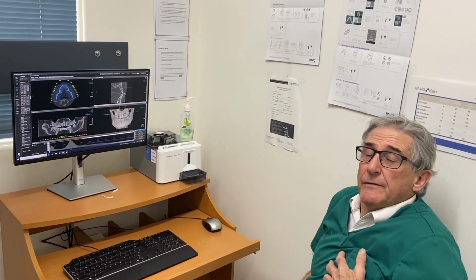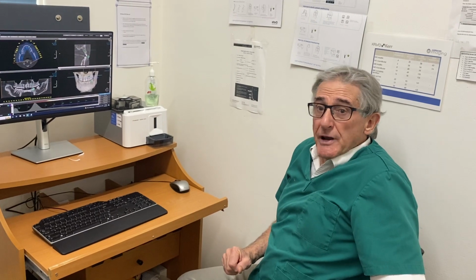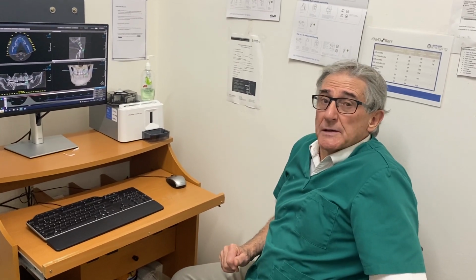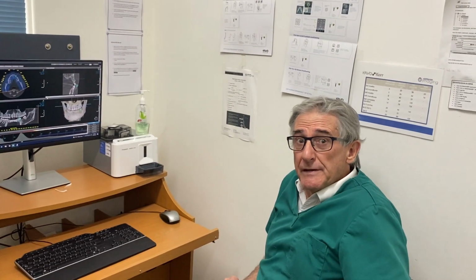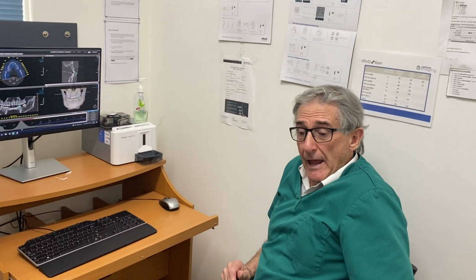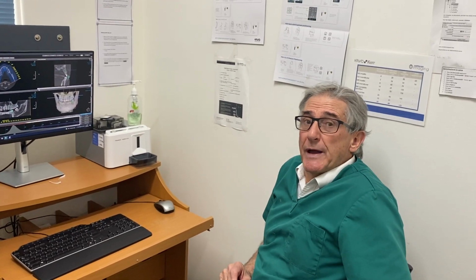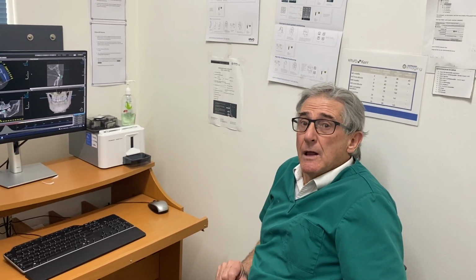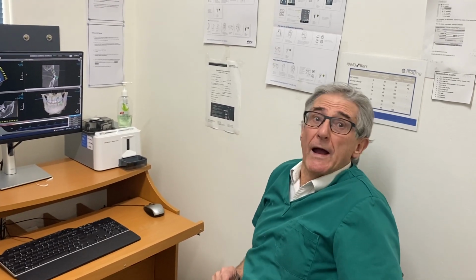Terrifically helpful. If you're not doing implants, you're doing complicated jobs. I think I wrote down 19 different applications of this system to general practice dentistry, from broken cusps and broken roots, MB2s, pre-prosthetic. I like to have a look at what's underneath before you go to any expense and hassle for the patient. And periodontics. It's the best system to really show the patient, particularly in that 3D image of the skull, where the pockets are and what we're doing, gum surgery or tooth removal or grafting or whatever.